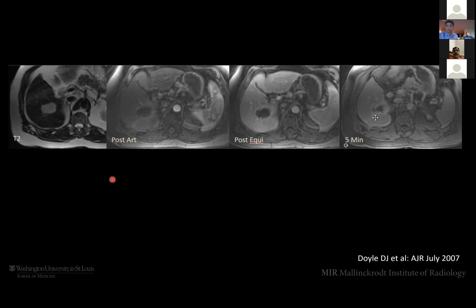If you see a lot of hemangiomas, you will come across sclerosing hemangiomas. This is in contrast to cholangiocarcinoma, which I'm going to share with you later on. But notice the rim of enhancement is peripheral and it fails to enhance into the center of the lesion.